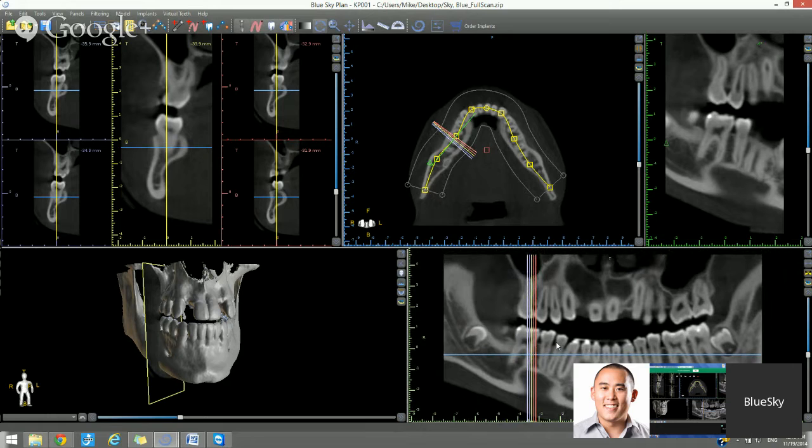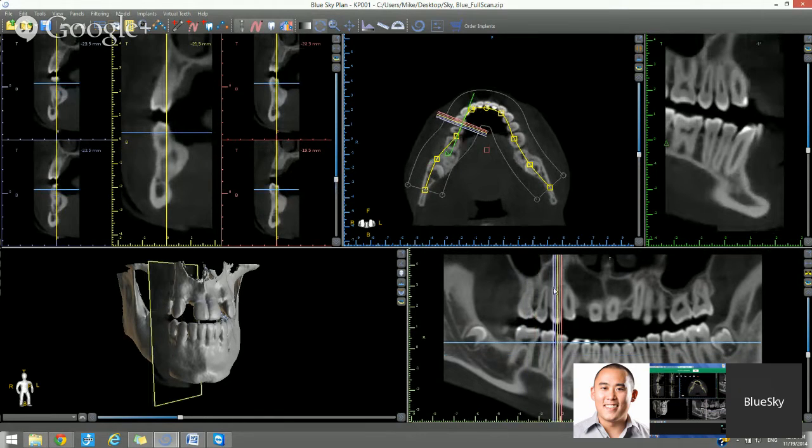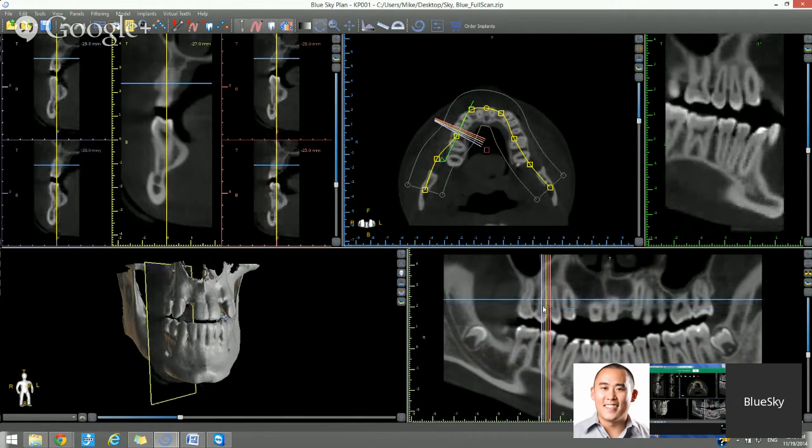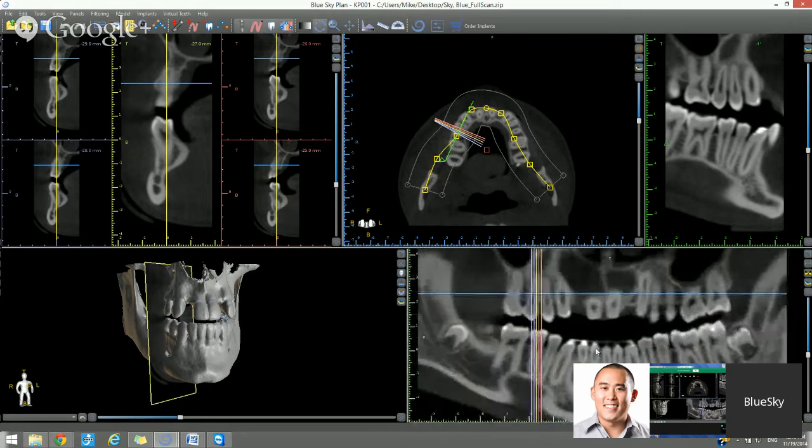And you're able to left click. Wherever you left click, you could see the multicolored lines jump to that location. We're going to discuss how these lines represent what we're viewing in the other images, in the other views. But wherever you left click, the lines go to that location, and all the other views adjust themselves accordingly to show you that position of the anatomy. Okay, so that's our mouse functionality. Again, the zoom in and zoom out with the right mouse button.